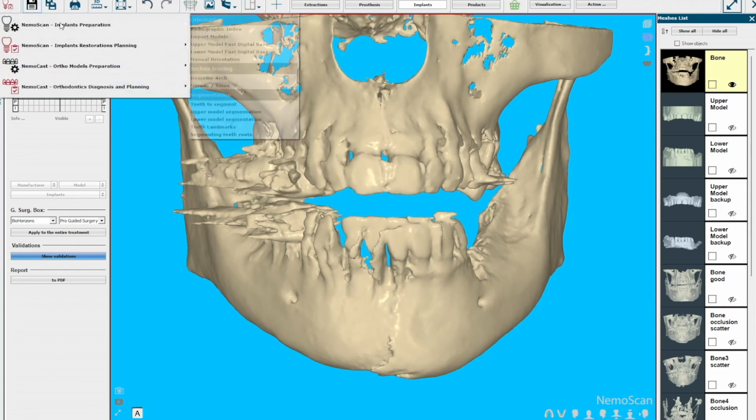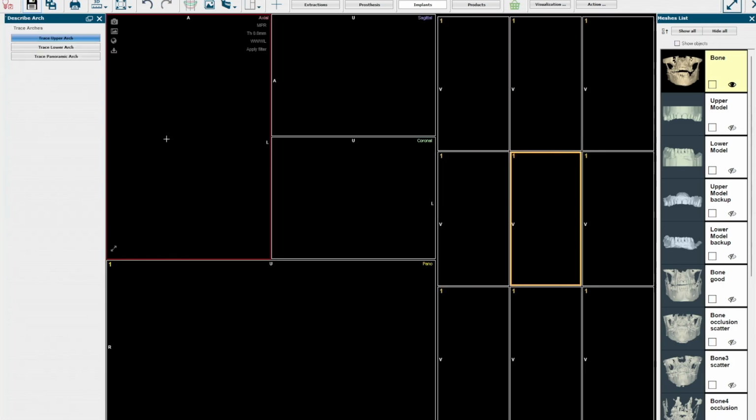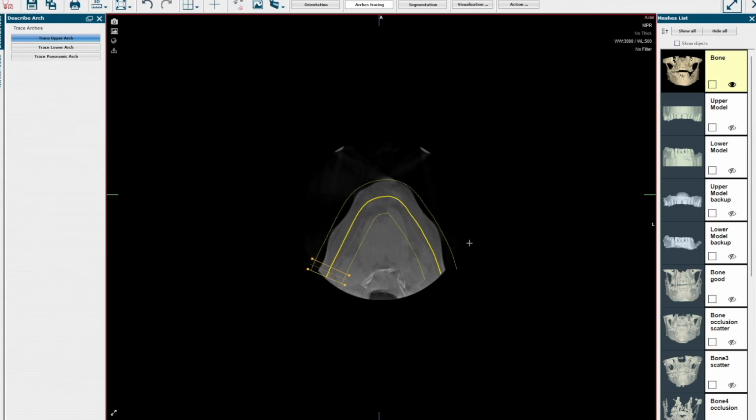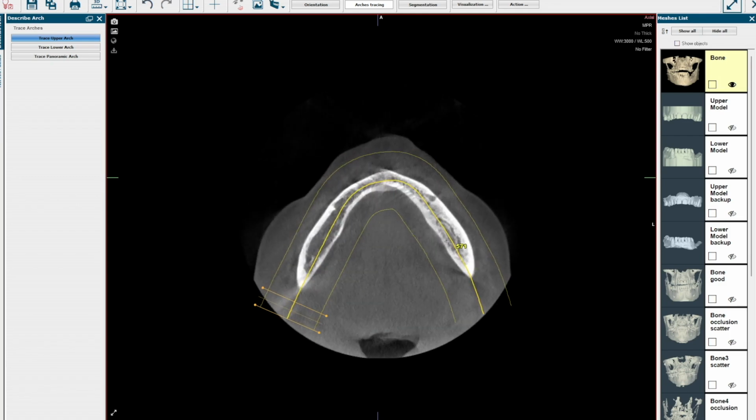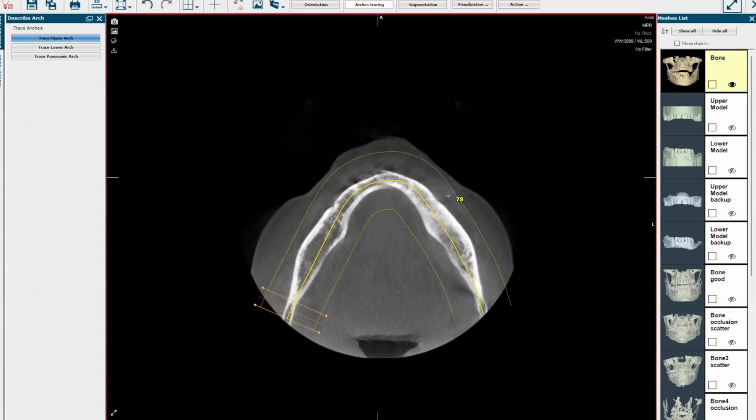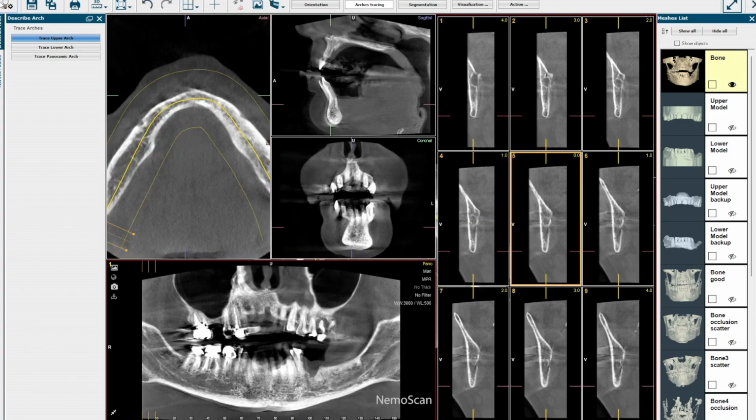I'm going to show you another angle that kind of helps you understand how to watch out for this. So we have here a scan of the mandible. Now you can see the arch going along here, and then there's a misalignment with the other side. So right to left, the patient shifted, and we get this double take image. Now which one's correct, we don't know. If we create a surgical guide and it goes wrong, then that's a bad thing. So we want to make sure that we check that to make sure the patient didn't move while the image was being taken.